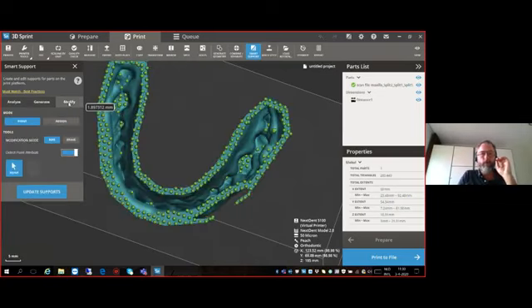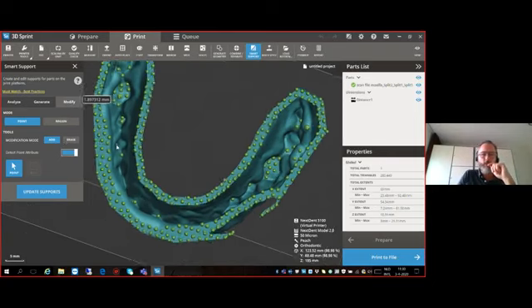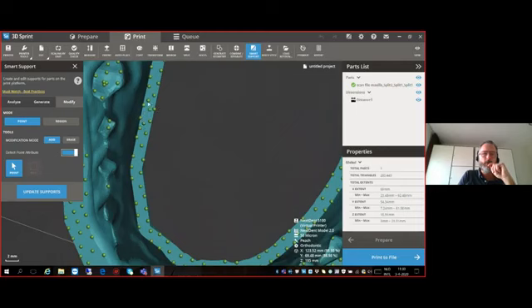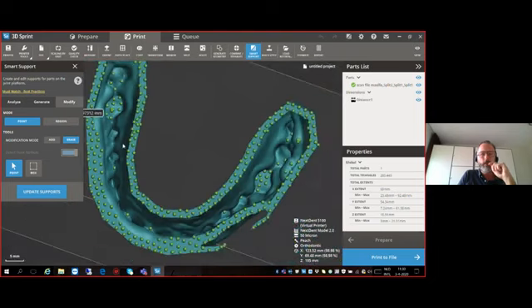And if you want to modify, adding a support is never a problem. You can just do that by here, modify, add, and with the left mouse button, you can add some supports. This is never a problem. Getting rid of supports is always tricky. You can do it by just clicking on it in the erase function, but this is tricky because you need support at certain places.